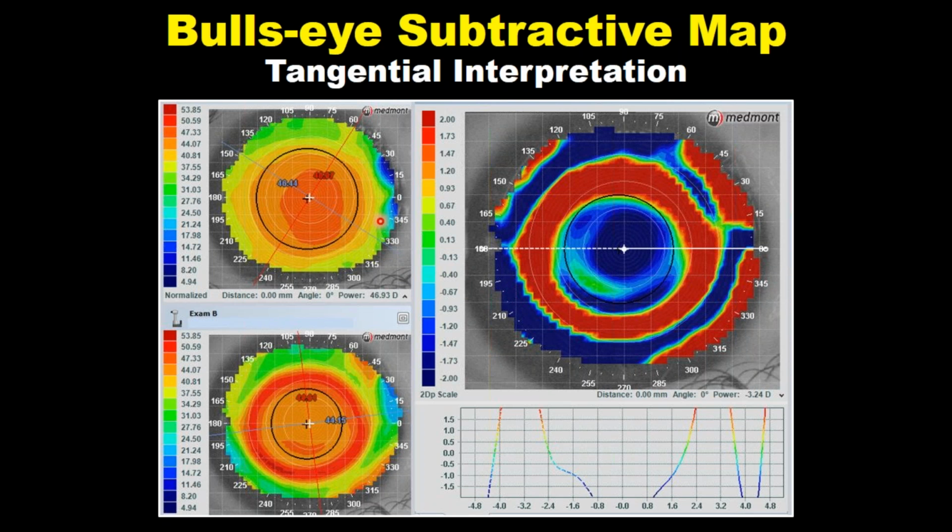Well, let's go over to our baseline map. Look at the displacement of the green-yellow border. We see that this cornea appears decentered inferior. So this is a decentered apex resulting in a slightly decentered outcome with our lenses. Now, nobody would argue that this lens needs to be modified.